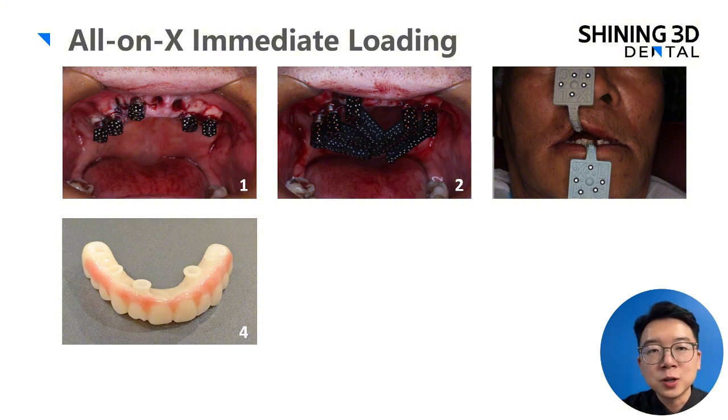It can reduce the waiting time of the patient, and once we recreate the new jaw relation for this patient, it will be based on the trajectories of the patient, so it's going to be much more comfortable for the patient. And once the design is done, while we are doing the fitting, there is minimum adjustment required to this patient's new teeth.